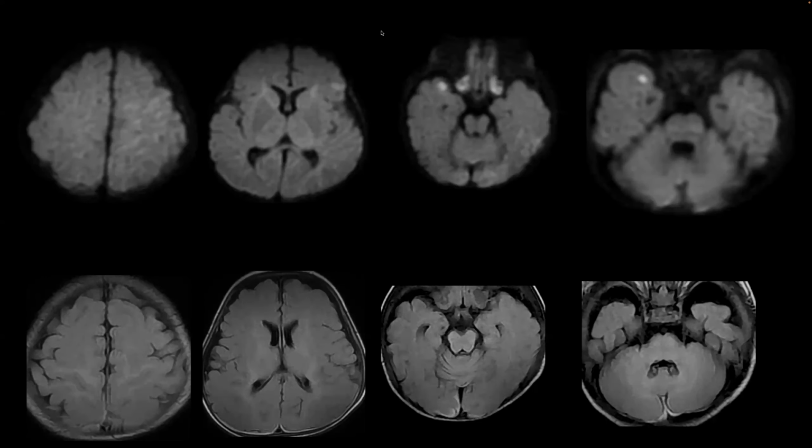The first subdural, Dr. Nihaal, what would you attribute that to? The first scan, you're saying that there is thin subdural. I was under the impression that the first scan was completely all right. I haven't seen it, first time I'm seeing it now. No, there is definitely subdural, but the shaken baby ones at least have a more significant amount of subdural hematomas than what you're seeing here. This is what we commonly see in post delivery related subdural collections, but they should not technically present up till 4 months of age. Does the first scan show basifrontal hyperintensity suggestive of any viral encephalitis sign?